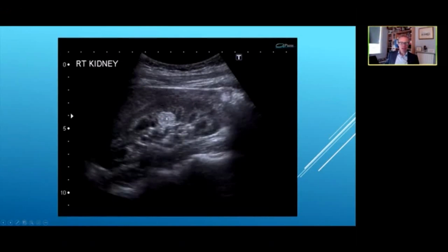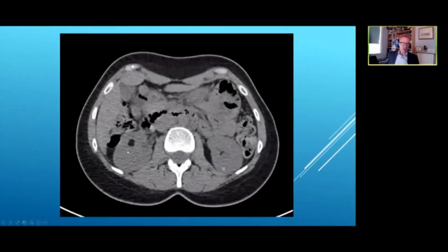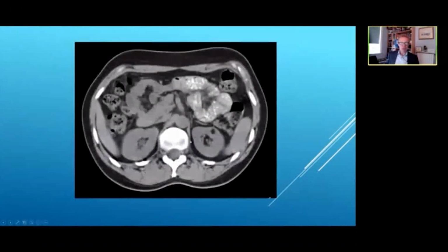Typical bright lesion seen on ultrasound, maybe an AML, could be a small RCC, confirm it with a non-enhanced CT: obvious fat, same density as the perinephric fat, same density as the fat around the edge of the patient. Same again here, there's a small AML on the left-hand side. I don't even bother giving contrast to these patients, we discharge them.